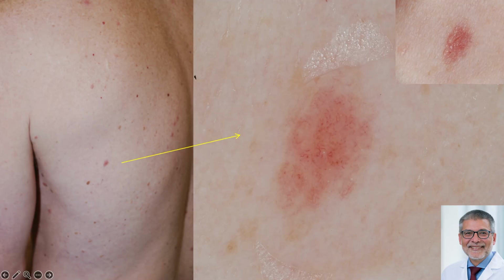You see a lesion and you see vessels, and you'll see later that vessels in a pink lesion, you should be thinking melanoma, which means that in every single nevus that you see in an individual with type 1 and 2 skin, you'd be thinking melanoma. So how do we differentiate the two? And here you start looking at the other nevi that this patient has. If the patient has no other nevi, you're kind of committed to a biopsy on this lesion.